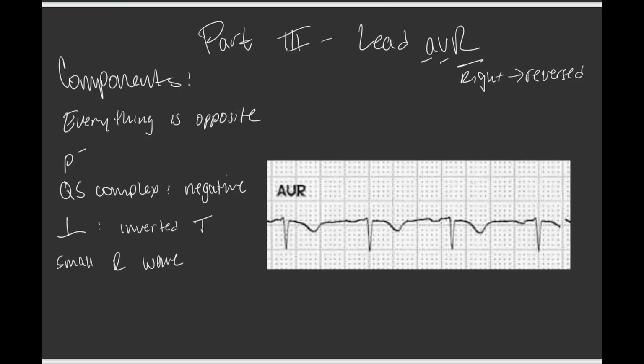Okay. And so here we have that negative P wave, or that inverted P wave. We have that QS complex, which is a negative deflection. And we see here that we have that inverted T wave.